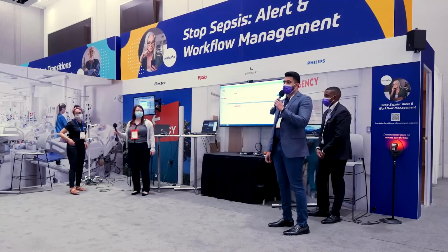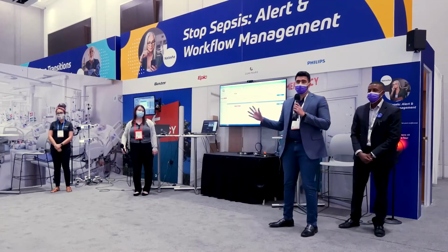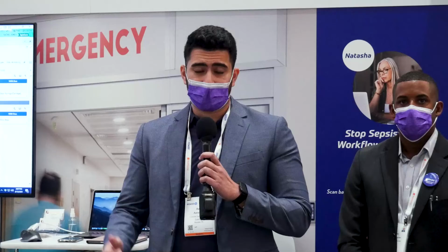This demonstration here is actually based on a real-life patient case. This entire workflow that you've seen here took a maximum of 15 minutes. The average length of time in detecting sepsis in patients is 7 to 48 hours. And for every hour you wait, there's an increase in mortality of 7 to 10%. Through this interoperability showcase, we're able to provide a process of detecting and treating a patient with sepsis in a quick and efficient manner. Thank you for your time.